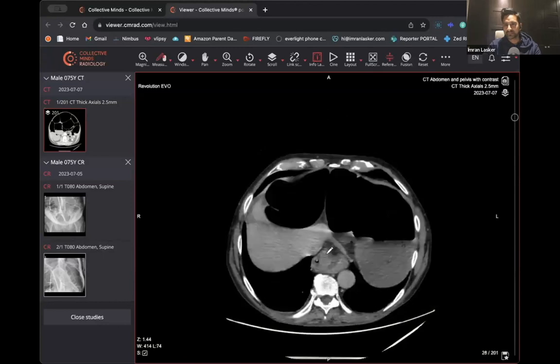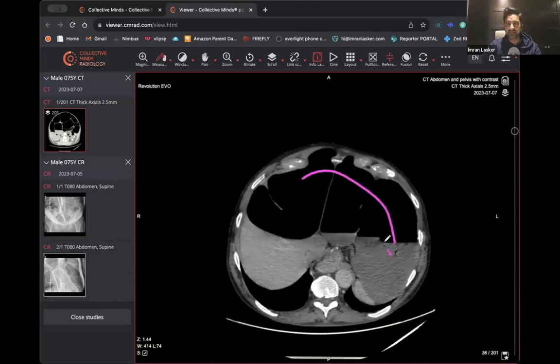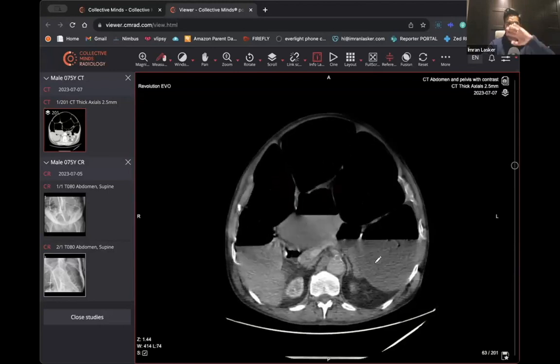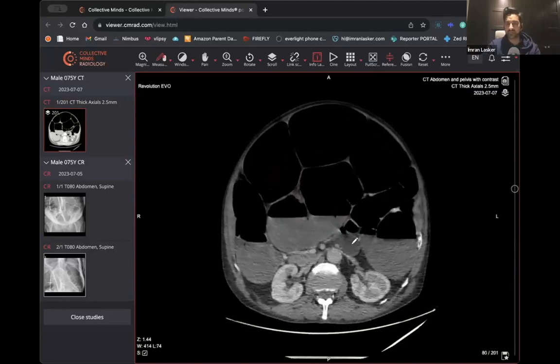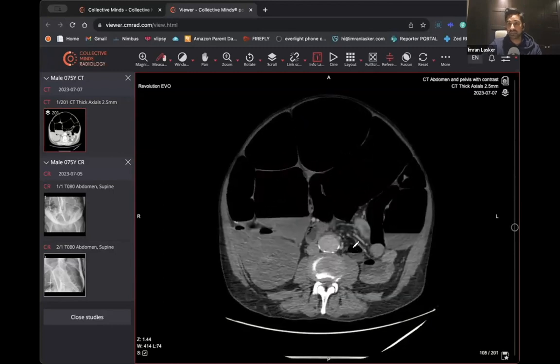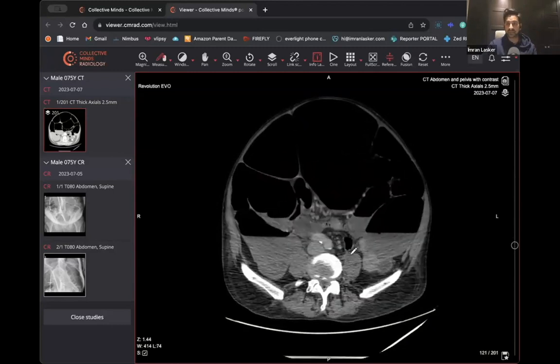Now, as we scroll, you can straight away see that there's loads of this dilated bowel, right? And again, you can see these lines that go across. On this one, it does look like it goes all the way, but this one doesn't go all the way. And plus, it's more on the peripheral, the outside of the abdomen. This can be really daunting when you're first doing on calls and you're not entirely sure what's going on. You think, oh, there's so much dilated bowel.